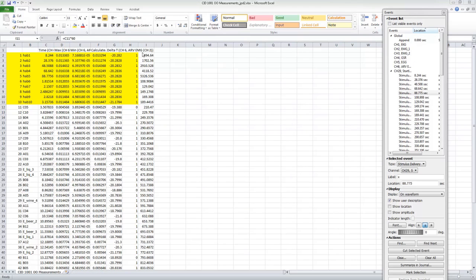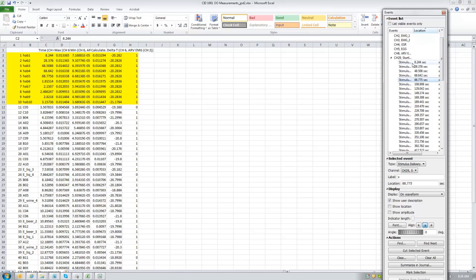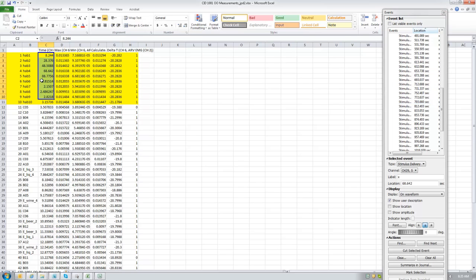Now one of the problems that you're going to notice is that when we pull the times of administration into the Excel and compare it to our event list from Biopac where we can click on each trial, once it gets into the minute range, starting with trial 6, the event list keeps it in seconds the whole way down, but our trial list starts to convert to minutes.